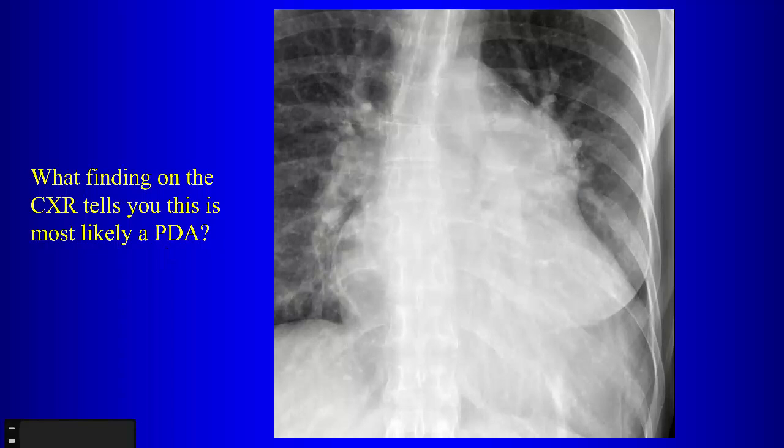The calcification between the aorta and... yes. The calcification here in the AP window, right? That is the calcification of the ductus arteriosus, okay? It's common for these to calcify in adults. Remember, we get calcification of the ligamentum arteriosum, right? That's a thin calcification, that's normal. That indicates a closed duct, right?